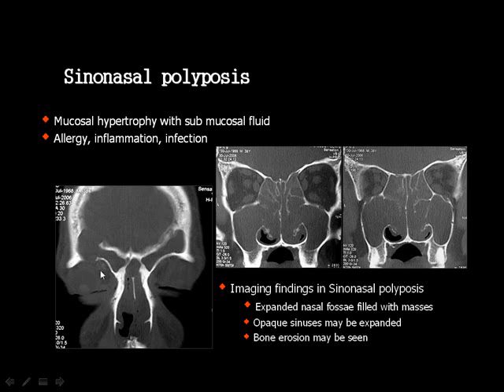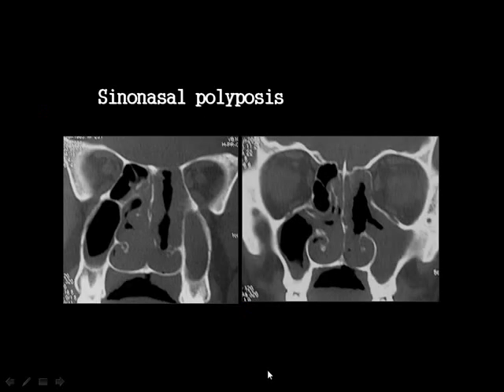No, and you can see this erosion is clear cut, not the aggressive type of neoplasm. I'll show some examples of tumors. Yes, and at the stage of this rarefaction, you may get breaching of the bony margin itself. But the neoplastic erosion is more aggressive, and you see more soft tissue component extra-sinus.